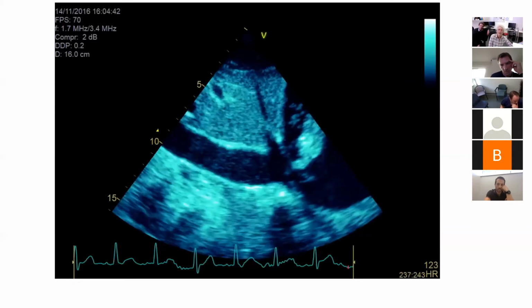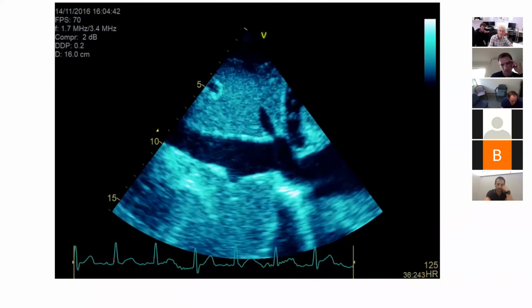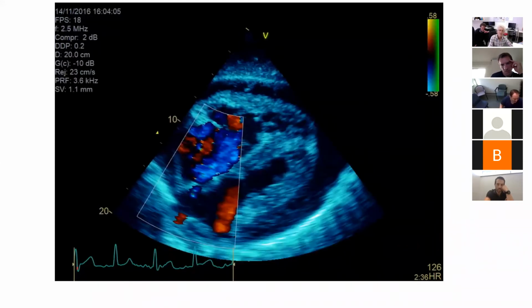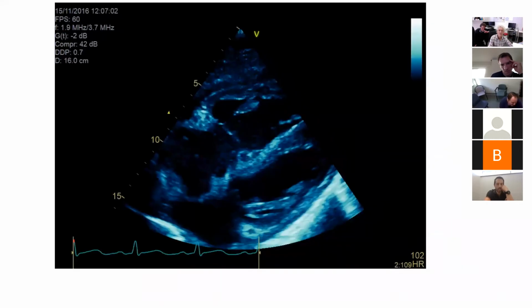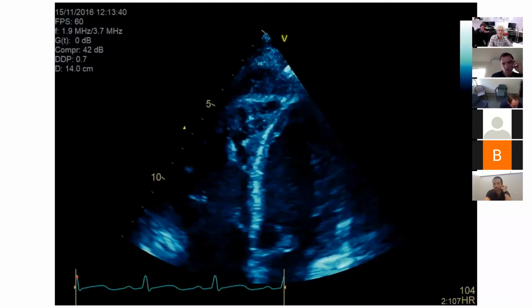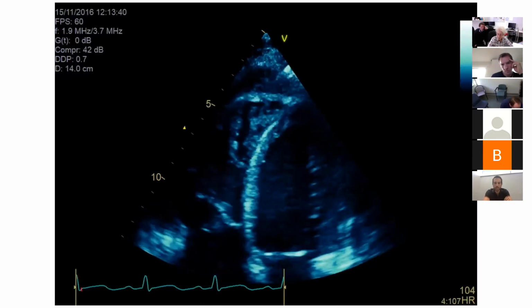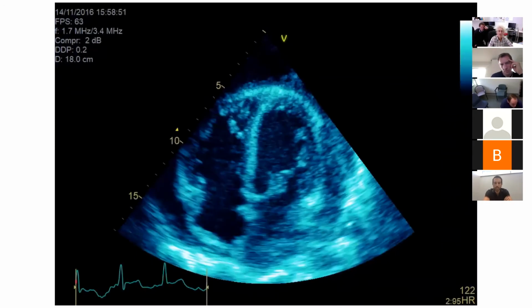If you look at the apical chamber, you get the impression that the left atrium is collapsing. And I agree, as Lee said, if that's the lowest pressure chamber, then that's likely where you're going to see the first evidence of chamber compression.